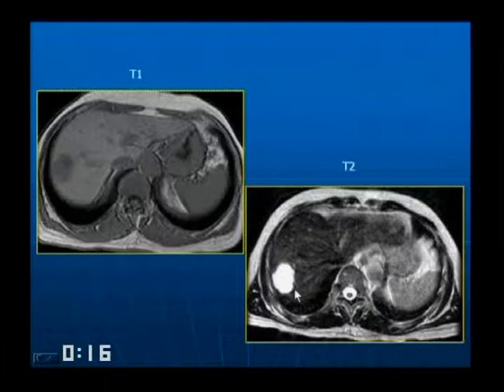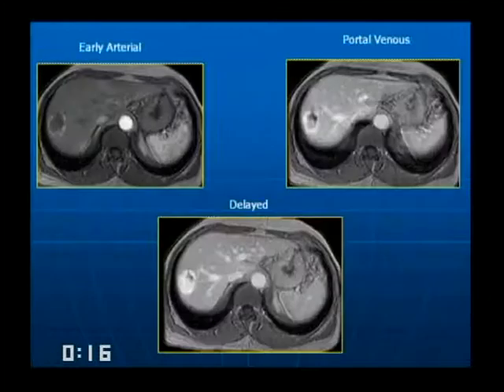And is it homogeneously or inhomogeneously bright? Homogeneously bright, right? And what happens when we infuse? So this should be a what? Hemangioma. Wait a minute. So let me ask you. In a hemangioma, don't you get complete fill-in? Why is there a little area that's not filling in? Does that sway you away from hemangioma? No, it does not, right? So it should be hemangioma.